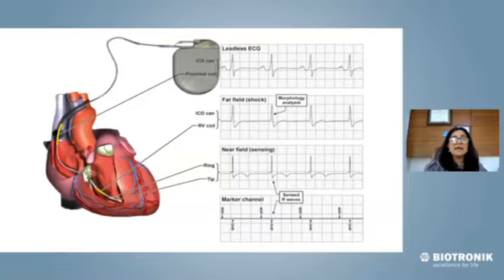This ICD can has the lead, and the lead is going into the superior vena cava, into the right atrium, and subsequently the right ventricle. You can clearly see in the leads there are two yellow thick lines, and those are ICD coils. This is the RV coil, and this is the SVC coil. Often today, we do not have the SVC coil, which we can discuss later as to why that happened.